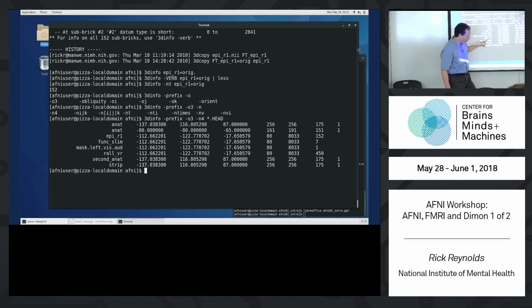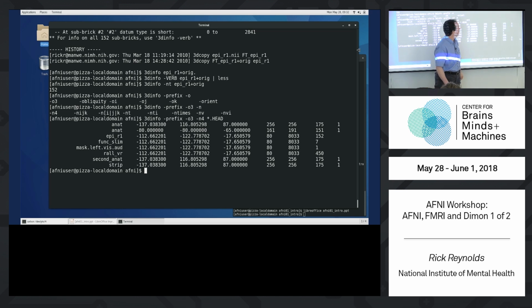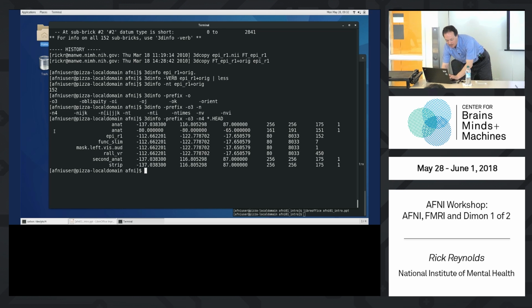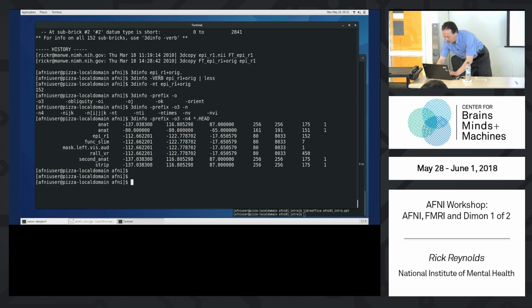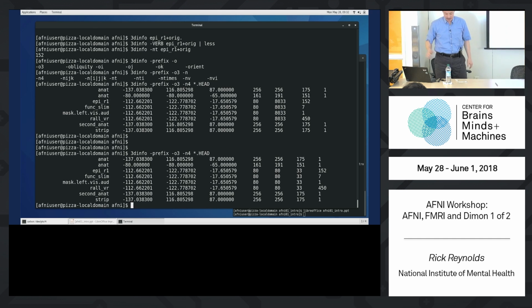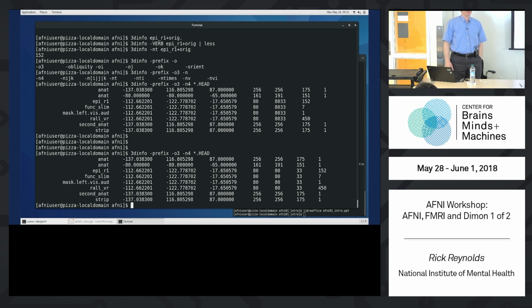The spacing is screwed up here. So that should be 80, 80, 33. I don't know why the spacing is messed up here. So when in doubt, I'll blame Gong. Let me just run that again. Yeah, so it was when I widened my screen. So the spacing is good if I just make it bigger first and then run it again. So anyway, now you see the 4 dimensions there. Anyway, so that's some information about the data sets. Any questions about this?